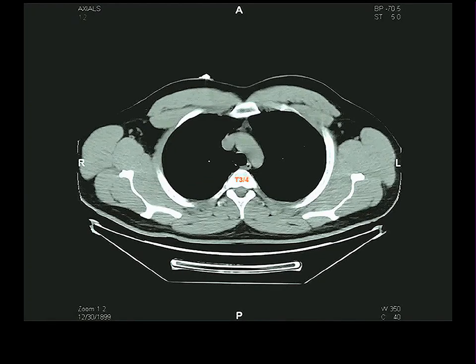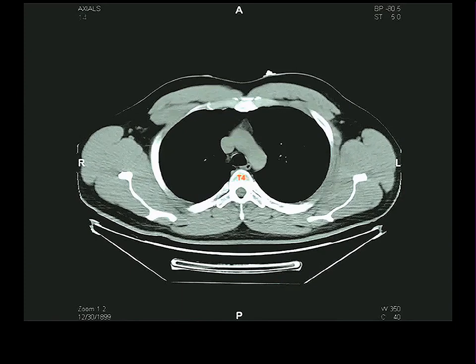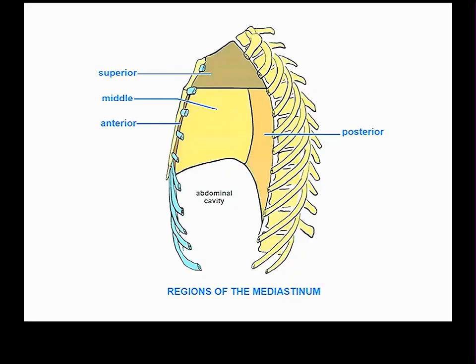Down and down. And now the second ribs are approaching what is the joint between the manubrium and the body of the sternum, which is called, as you know, the sternal angle or the angle of Louis. And here is the costal cartilage of the left second rib. And we haven't got quite low enough to see the costal cartilage of the right rib, but now we do. And this, in fact, is the joint between the manubrium and the body of the sternum, where the second costal cartilages join the sternum. And now, I won't do any more of these, all these sections I say are available.